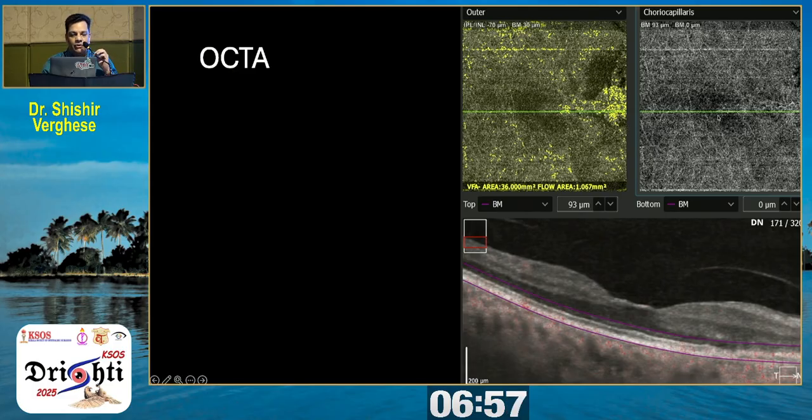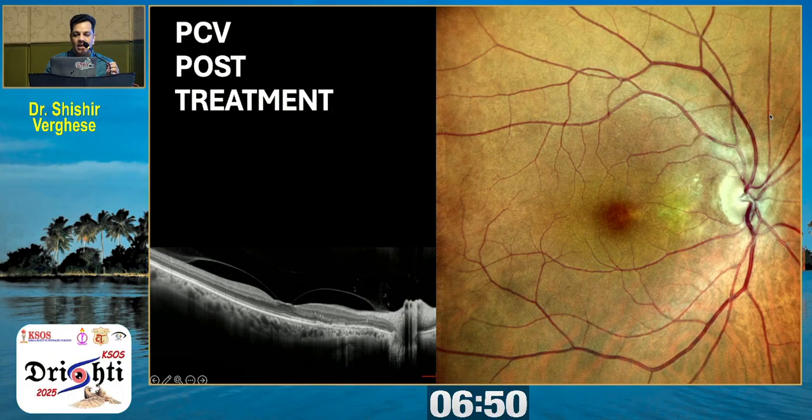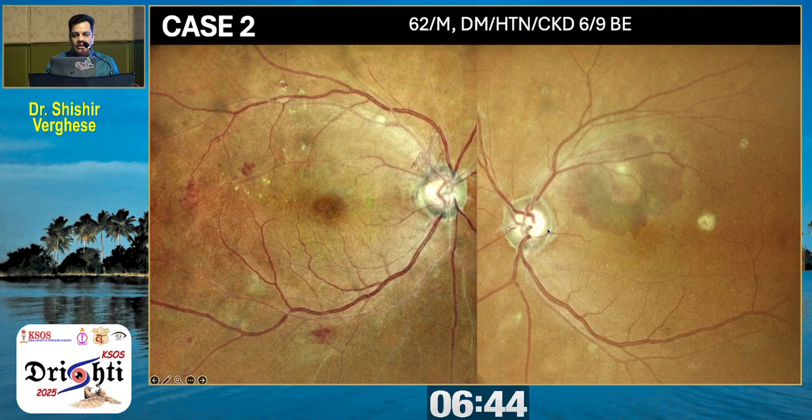And then on this other OCT, the deep slab, you can see this nice branched vascular network, what you see. And then post anti-VEGF and a shot of focal laser, the patient improved back to 6/6 vision. So let's go to another case.